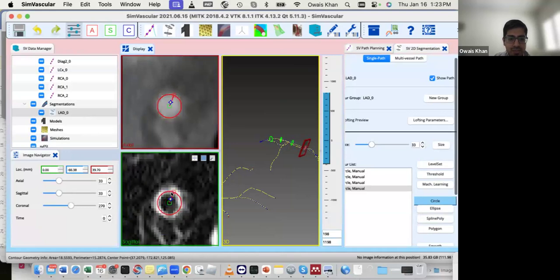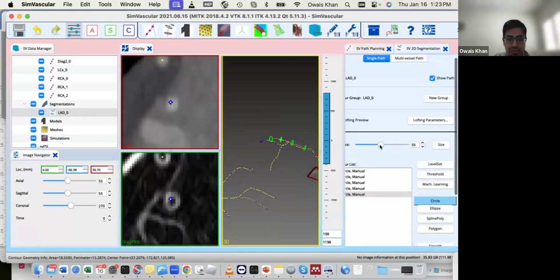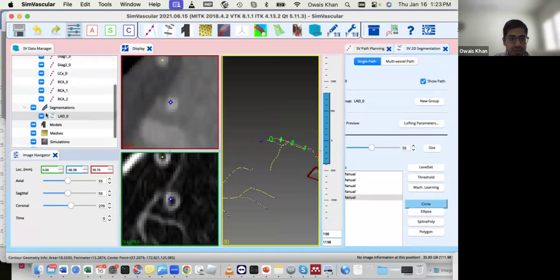So you can see when I place my circle, it's right in the center of this gradient, right? So that's the typical approach I take. Place it right in the center, and I keep going, place a circle. Oh, I don't know which one I am looking at.